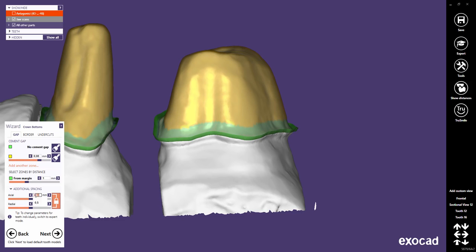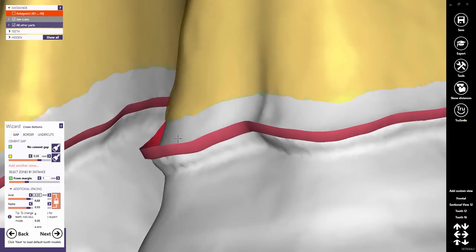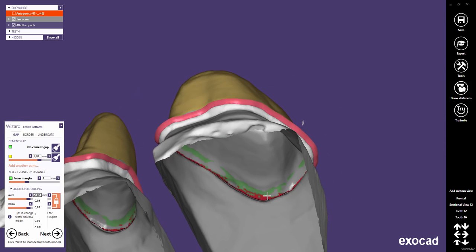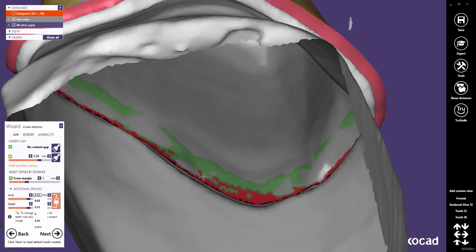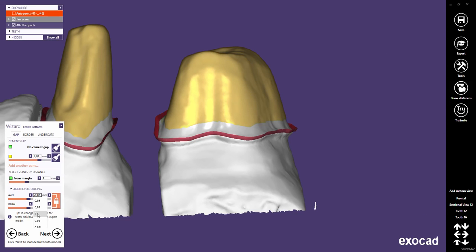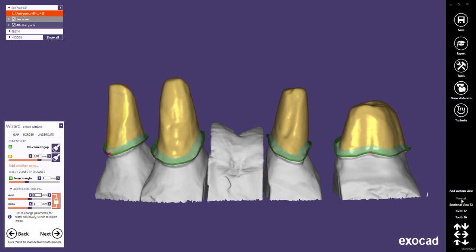You can also use negative values to create a tighter fitting. The result would be a crown that has a smaller bottom than the die. Note that negative settings may lead to manual work on the restoration. However, trying to improve the fitting by changing the additional spacing values is a workaround, not a solution. A properly tuned cam system should be able to achieve good fittings with minimal additional spacing.